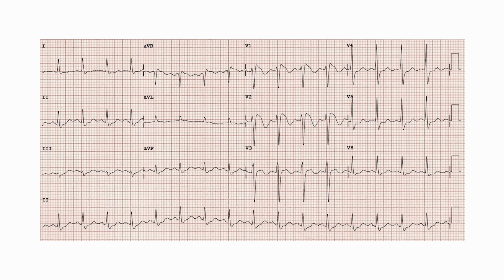This is a patient who has a strong family history of sudden cardiac death, and this patient has come with a collapse. Yes, you guessed it right, it is Brugada syndrome. If you look at the septal leads, you see that RBBB kind of picture, and you need to differentiate this from Wellen's. Wellen's is coming in with chest pain, Brugada is coming in with syncope.